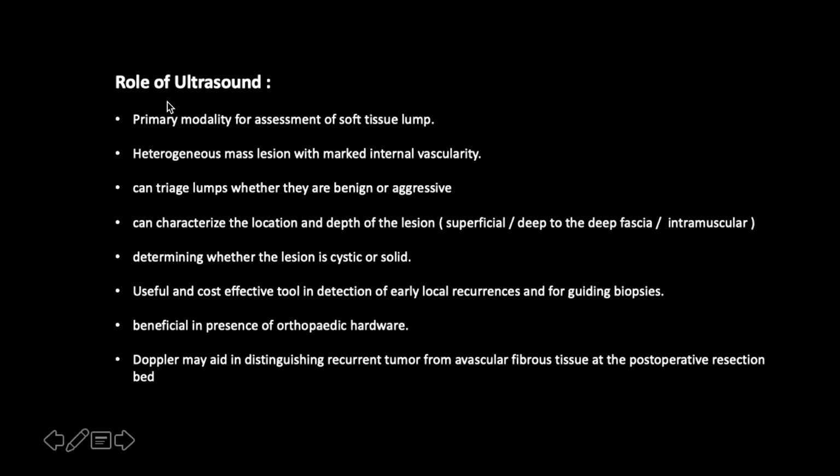And ultrasound, in case of sarcomas, shows heterogeneous complex mass lesions with significant internal vascularity. It will help us in locating the depth, whether it's superficial, deep to the fascia, or intramuscular. It will help us in characterizing whether the lesion is cystic or solid.